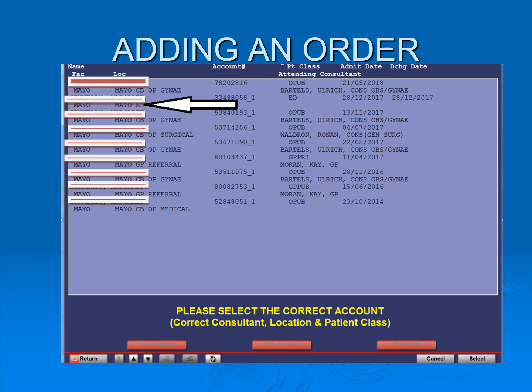Please remember when presented with the Select Account page that the default account will not always be today's account, so you should actively select the account on every occasion. Do this by highlighting the correct account, then click the Select button, which is in the bottom right hand corner of the page.